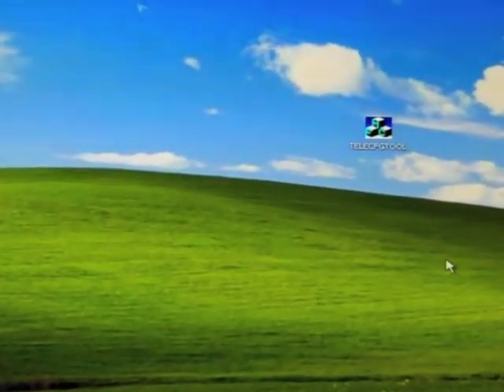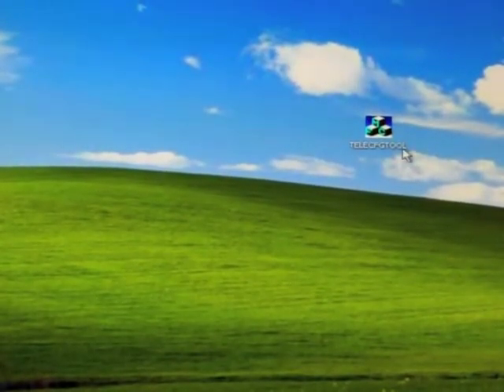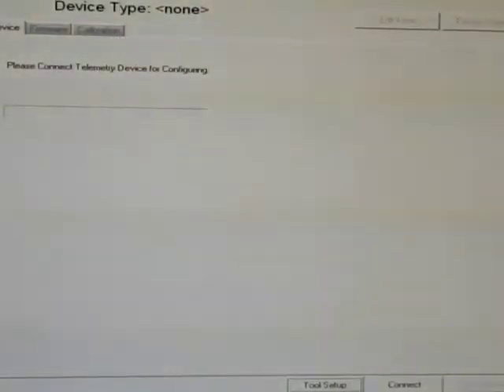Today we're going to learn how to program an M2601B using your teleconfig tool located on your local PC or laptop computer. Programming using your teleconfig tool. Your icon should appear on your desktop or laptop. Double-click on this icon and your programming tool will pop up.